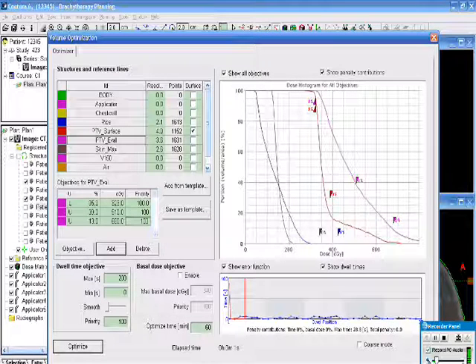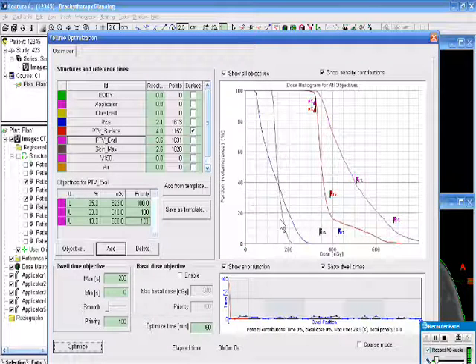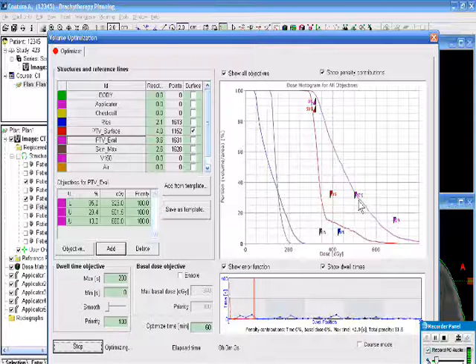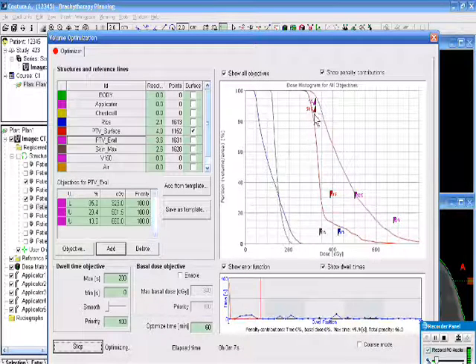And you can see that we haven't had to leave the optimization routine to evaluate these points. That's why we have them in there. Well, this case is still too easy. So I'm going to take this guy and move him down a little bit because it's just too easy. You can see that it's 100%, 60, 40. This is where all the work is taking place, and it's being held up by this surface one here.